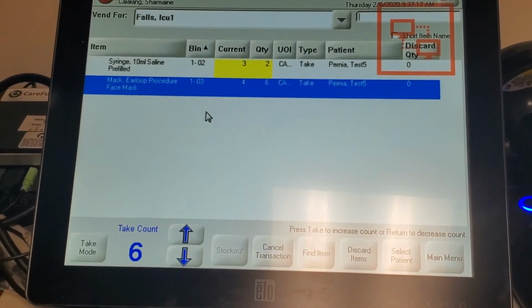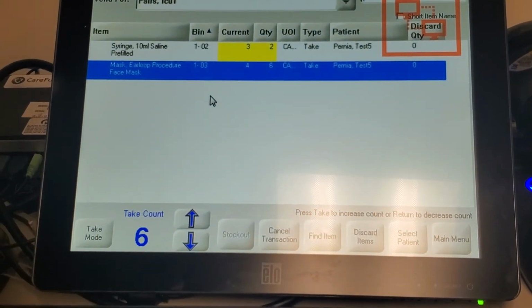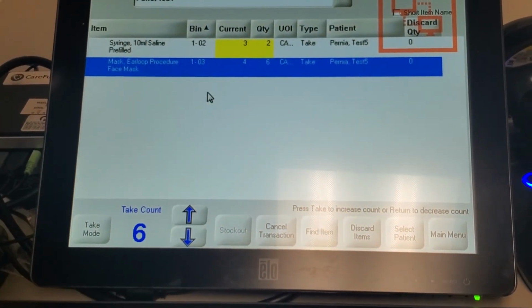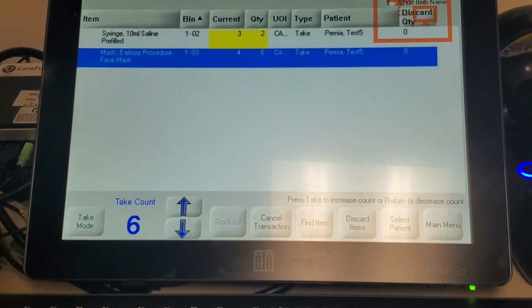I know at first it's going to be a little bit more challenging. Only one card. We're going to give 1 card per nurse. For example, if 1 nurse has 6 patients, we have 6 rooms also.